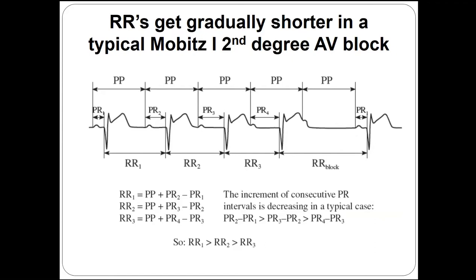So it's a sinus rhythm, but it's a normal one. Yes. Okay. Now, so this is the explanation.